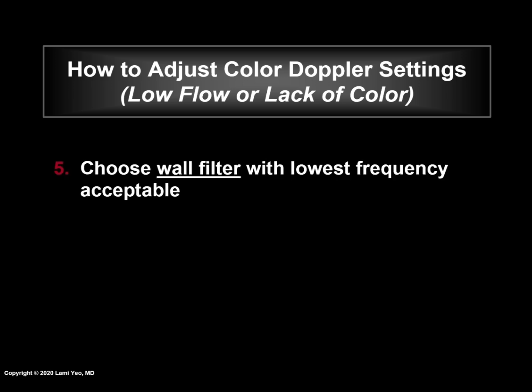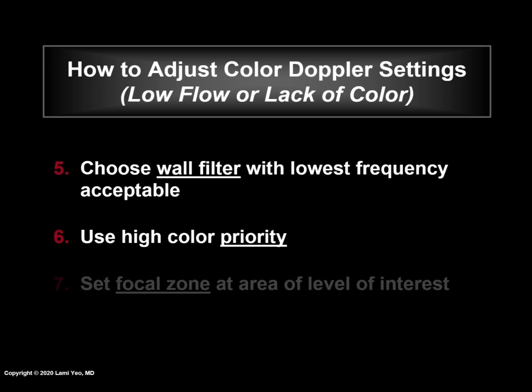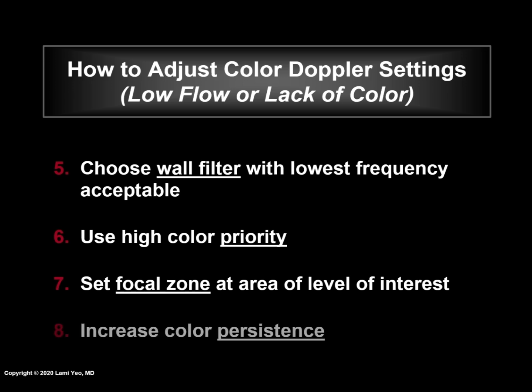Choose the wall filter with the lowest frequency acceptable to prevent loss of true diagnostic Doppler information. Use high color priority. Set the focal zone at the area of the level of interest. And increase color persistence.